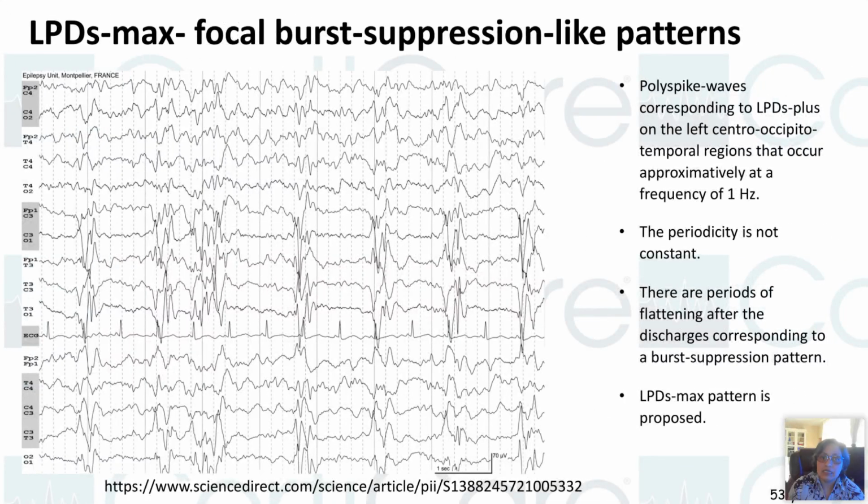All right, another example of focal burst suppression-like pattern. Again, it is not burst suppression. You see the periodic discharges and suppression, attenuation in between them.